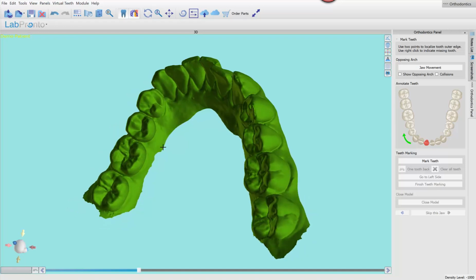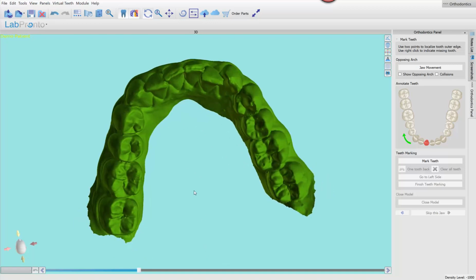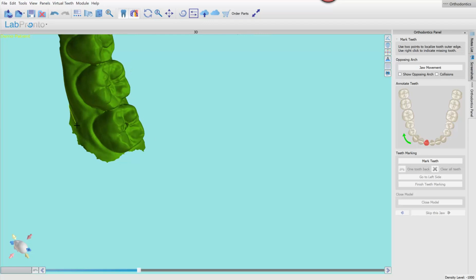Lingual looks halfway decent. That's probably unnecessary. Didn't really help much there. Would have been nice to get a little more data apical to that molar, but it'll be all right. Don't like rough borders out here.